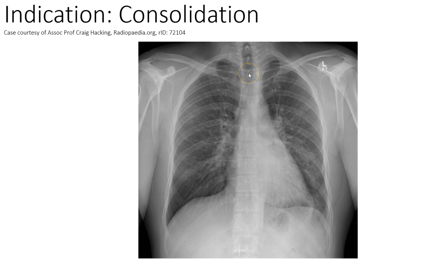This is the spinous process, and I'm looking at the distance, and there might be a little bit of rotation here. I feel like this one is just a little bit closer to the spinous process than this one, so there might be a little bit of rotation, although not a huge amount. Counting the ribs, 1, 2, 3, 4, 5, 6, 7. Again, we've got a slightly inflated set of lungs here. 1, 2, 3, 4, 5, 6, 7. Perhaps somebody able to take a really good deep breath and hold it. Maybe they've been a singer or something.